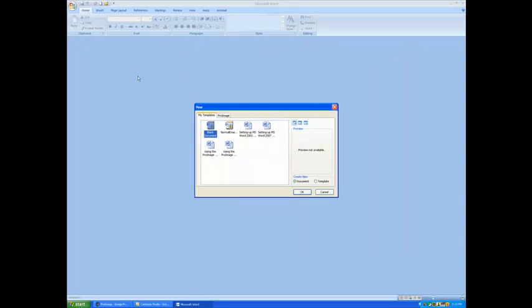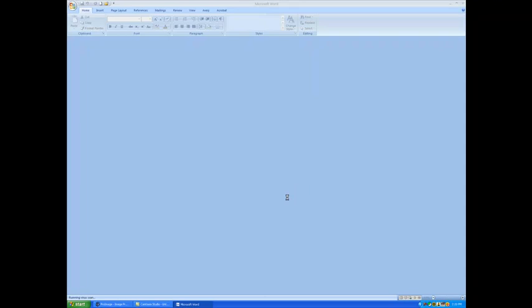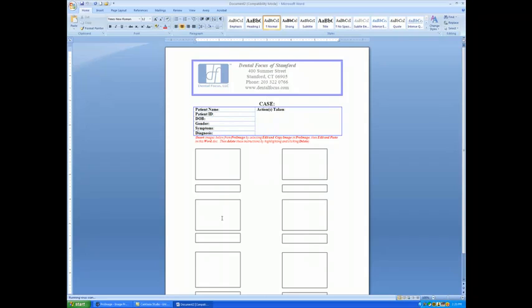By clicking on My Templates, notice that I now have templates that are set up and ready to use. And by clicking on the ProImage tab, and this is all done in the setup instructions, I have these various templates, and I can open any one of these templates as a document. So I'm going to go ahead and hit Case Study 6 as a document, say OK. And here I have my logo and my letterhead and all, and I'm ready to go. I also have instructions here that I can delete that just remind me how to do this.